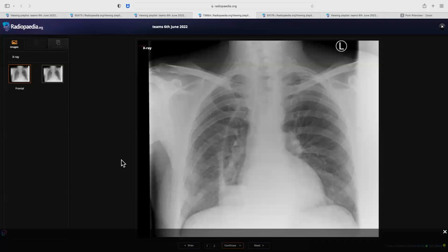It could be an aneurysm from the right side of the heart. What is the density of this structure? If it is a vascular structure, how will it be? You said aneurysm. Yes, the vascularity actually is going with the blood vessels.